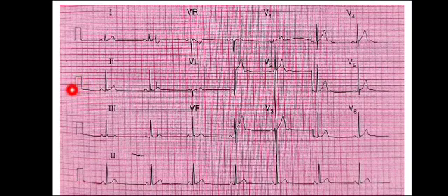So here you can see that this is 1 millivolt, and if we calculate the millivolts in this ECG, this is 1 millivolt, 2 big boxes, then the 4 boxes are 2 millivolts, and 10, 20, 30 small boxes are 3 millivolts. So this is again both for male and female. We can see that it is greater than 2.3 millivolt for females and it is greater than 2.8 millivolts for males. So again, by the Peguero-Lo Presti criteria, there is left ventricular hypertrophy in this ECG.